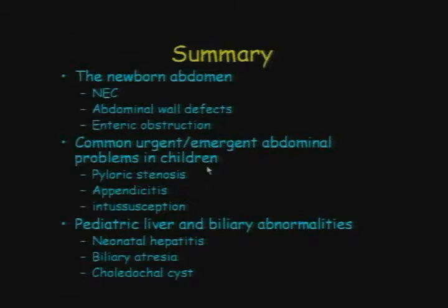So this is a quick run through of abdominal abnormalities in the pediatric population.